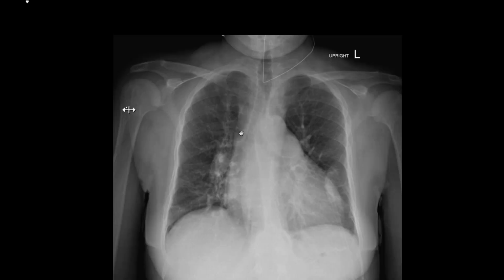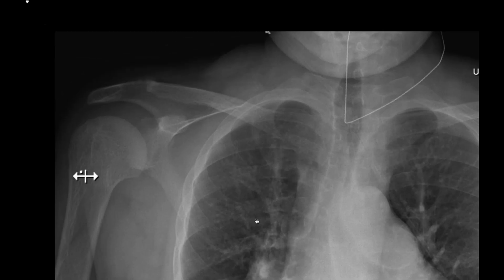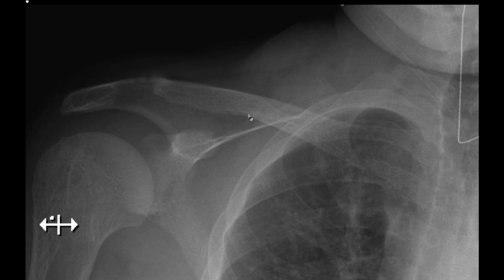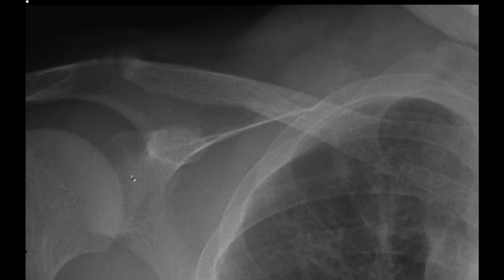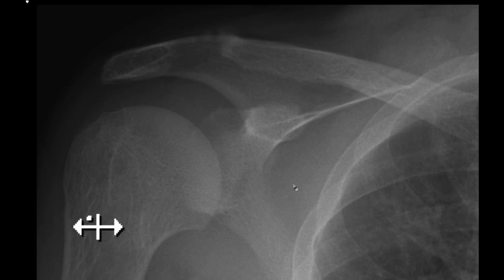There's another clavicle finding that's interesting. If you could scroll back to the clavicles and mag it up, you lose the corticomedullary border here. It is sort of merged, so that you've got these thickened trabeculae that smudge the endosteal surface of the cortex, and so it becomes hard to distinguish cortex from medulla in the bone, and that right here. That's sort of sclerotic. Yeah, and the top surface of the cortex too is ill-defined. Right there, maybe. Right, because of the thickening of the trabeculae, you lose your sharp definition. And then this fuzzing out of the distal clavicle is classic.